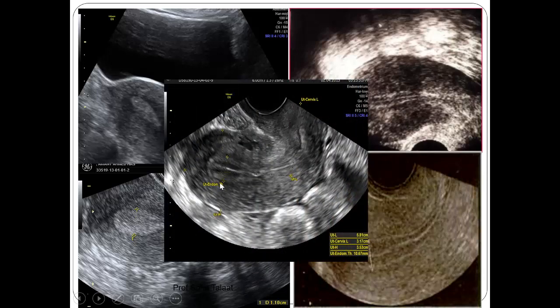And then this is the periovulatory, where we find striated appearance. Some books say 5-line sign, but I used to say that it is striated appearance occurring in the periovulatory phase.